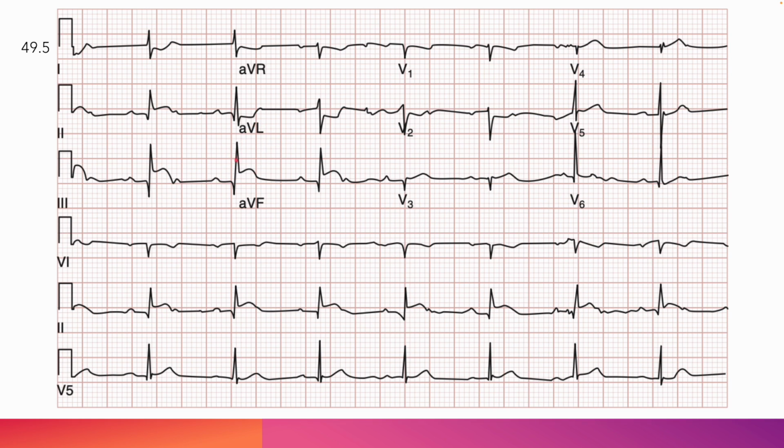Now, looking at this ECG, you can see that there is ST elevation in leads 2, right here, 3, and AVF. Now again, we have to look if there's an inferior lateral extension. So V5, V6, there is nothing. There are no Q waves, no ST depressions.